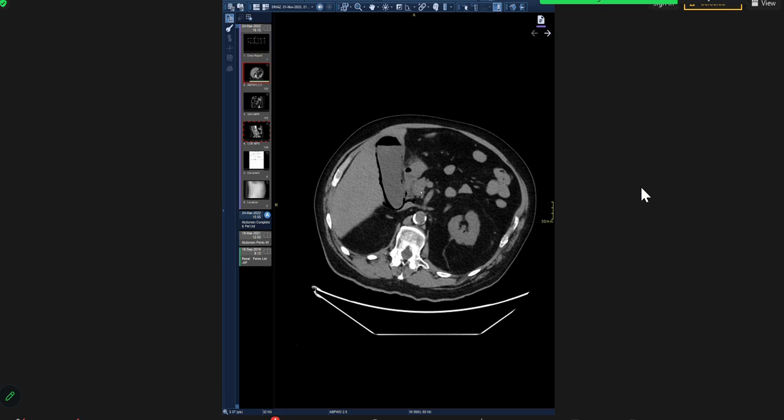In this, this is a male patient, and they say that men are affected more than females. And what happens in this, the cause for this, you have to be aware of that. Why did the patient get this emphysema? What happened? It is thought that there is some vascular compromise associated with the cystic artery, so the blood supply is gone.